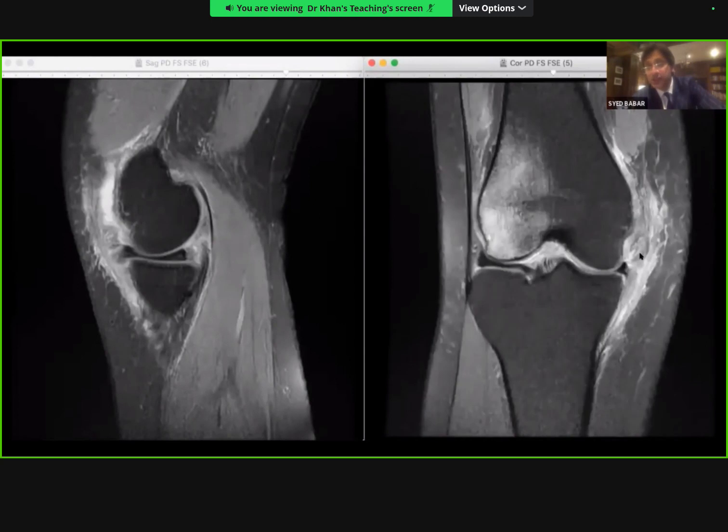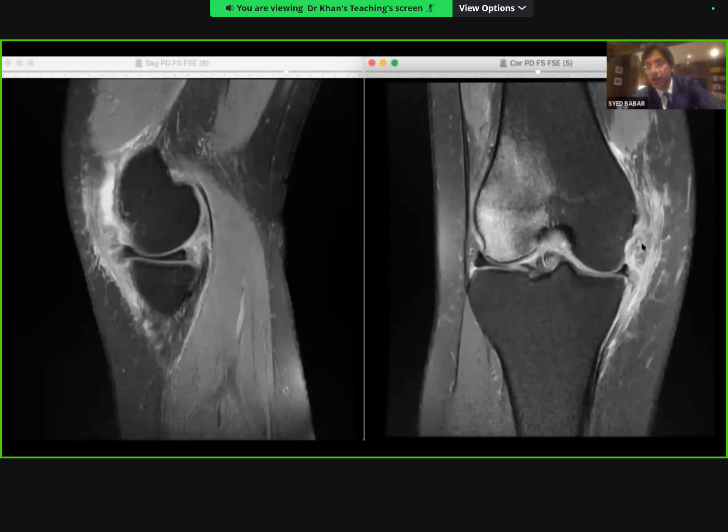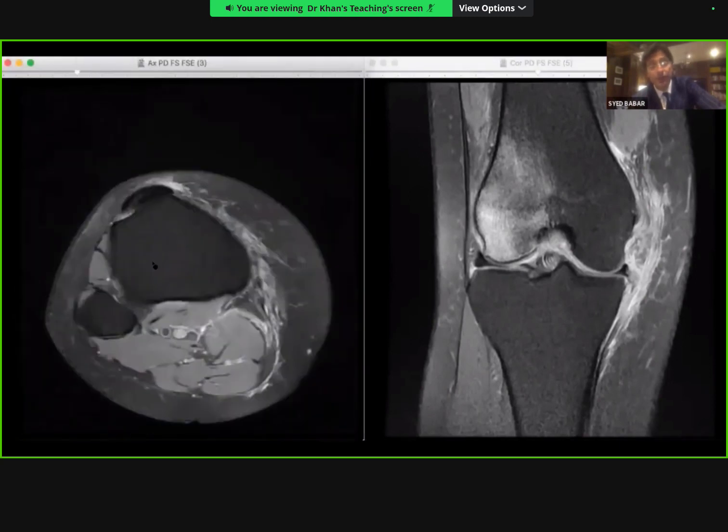And then at the femoral attachment, there's nothing there, it's just like a mince. There's hardly any fibers attached. I can't distinguish between the superficial and deep MCL. So I need to now bring up the axial on the other side because I want to look at this meniscus. Because remember, it's not just the MCL which attaches here. What else attaches? The medial patellofemoral ligament.